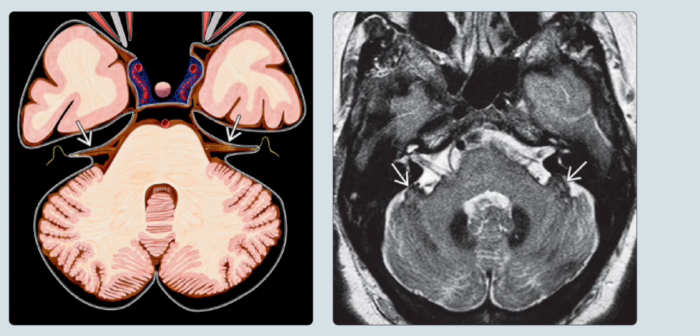Left is the axial graphic, and it shows the darker brown hemosiderin staining on all the surfaces of the brain, meninges, and cranial nerves. Notice that the cranial nerves 7 and 8 in the cerebellopontine angle and internal auditory canal are particularly affected.